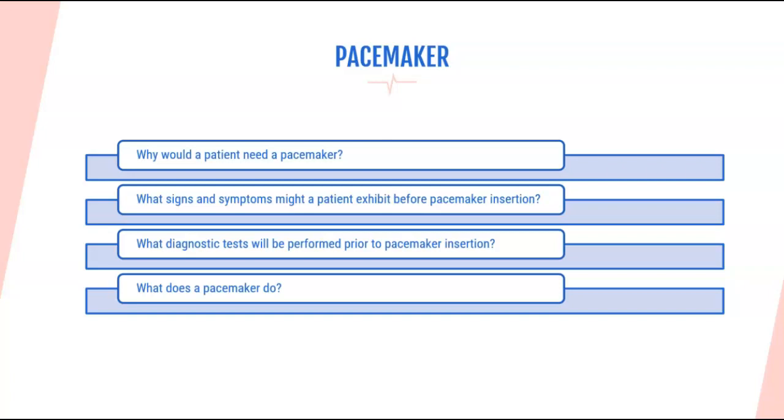You'll see a pacemaker spike on the EKG, followed by a P wave if the pacemaker is atrial pacing, or followed by a QRS complex if it is ventricular pacing. Pacemakers are usually set to 70 to 80 beats per minute, but it's ultimately up to the provider.